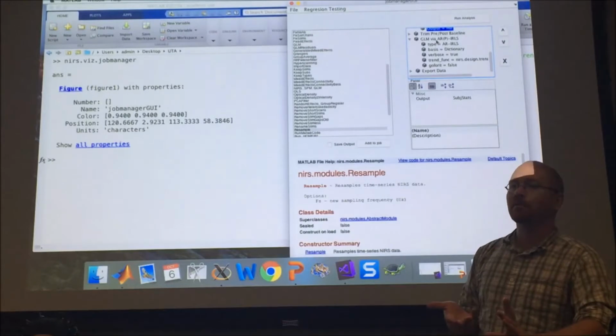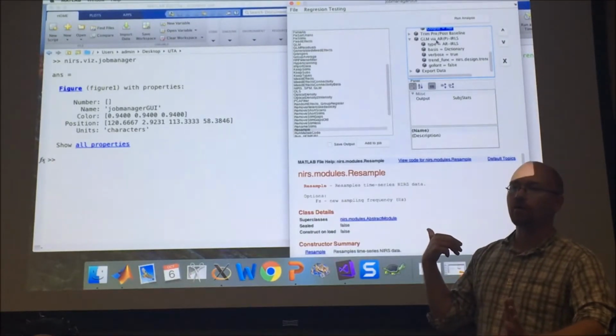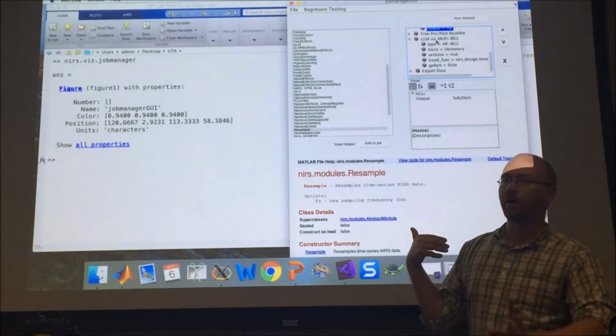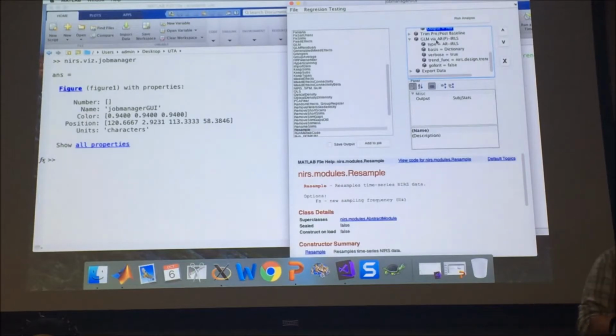It's just going to create problems when we try to solve the stats. If you turn the go for it flag on, it'll ignore those warnings and try to do it anyway. But by default, it's off, and so it's going to tell you if the model was really bad. In this case, the model is perfectly fine, so we don't have to worry about it. So if I hit this run analysis button, it's actually going to run everything right now.